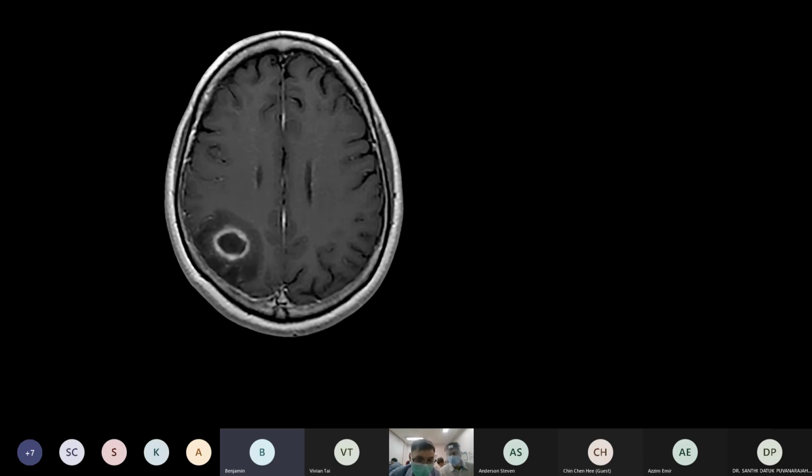Good. So the thing is, what MRI sequence are we looking at? As you look, although this is just a single plane view, what sequence is this? Right, I think this looks like a T1 sequence. T1 with or without gadolinium? This is with gadolinium, because you can see the meninges here. It's a bit bright.